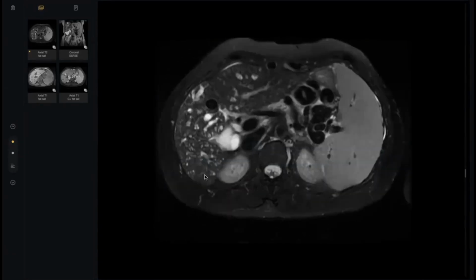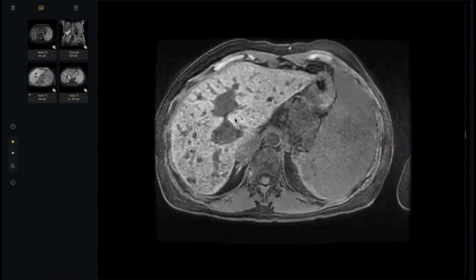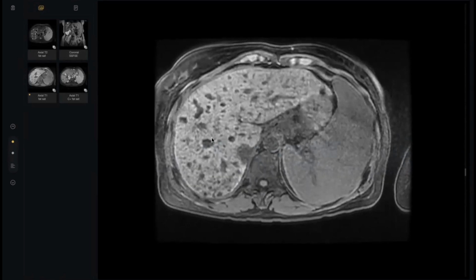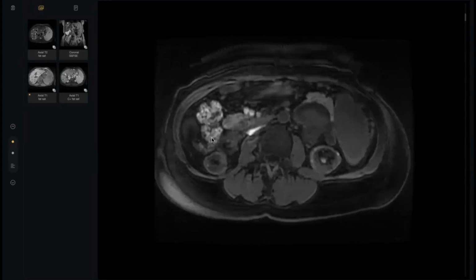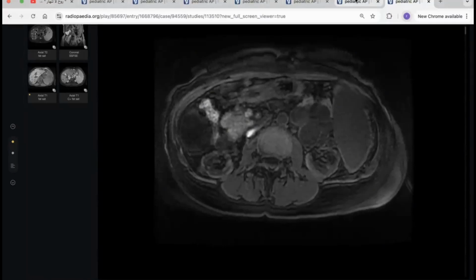When you see these collaterals and the splenomegaly, you must think about liver cirrhosis. The border is uneven and this is not healthy parenchyma, so you can see other signs of hepatic cirrhosis. So it is Caroli disease complicated by liver cirrhosis and portal hypertension. Thank you, doctor, so much.